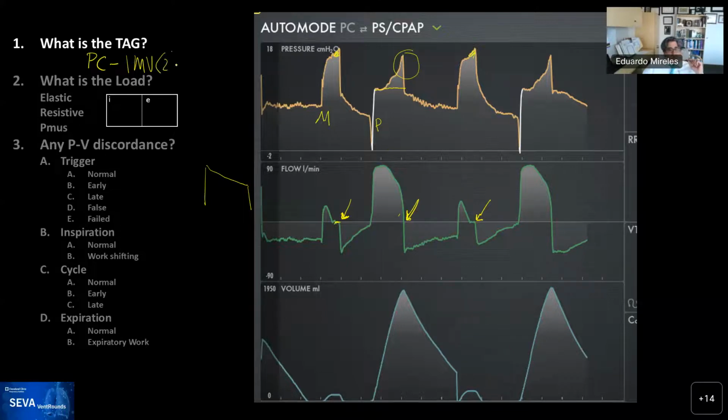You all identified this was a type 2, meaning that when there are spontaneous breaths, the mandatory breaths disappear. And for this, there's an algorithm actually, and I know Ariel has been working on trying to decipher, reverse engineer, understanding how they calculate the amount of apnea time that you need to have according to the rate to ensure that the pressure control breaths are turned off.